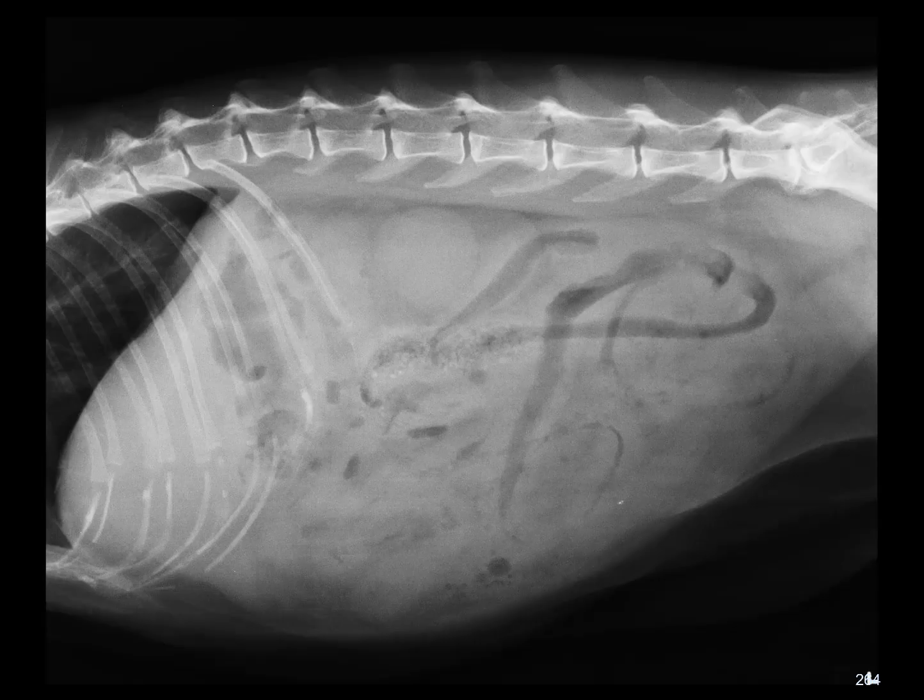So here we have a cat who has vomiting and diarrhea, and this is going to be one of those cases where we're going to be concerned about wall thickening, although it's certainly not definitive. When I look at a number of these small intestinal segments, they all seem kind of big. There's serosa to serosa there. So there's a lot of tissue opacity of these loops, and even this one here that has gas, and again, the impression of a thick wall.